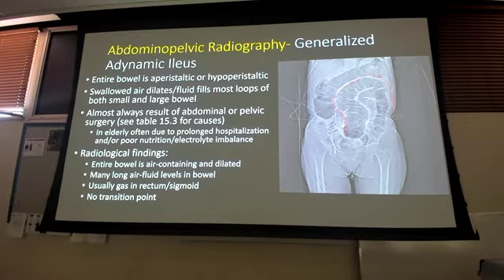Look at how large the bowel is compared to the other slide before, right? They're sitting on one another. I do have some valvulae conniventes coming across kind of like here in this loop here, but then when I get to some of the other areas, I got the haustra, which is just like a little bit, right? Just like a little line right here. It doesn't go all the way across. That's what that haustra is showing me in that aspect.